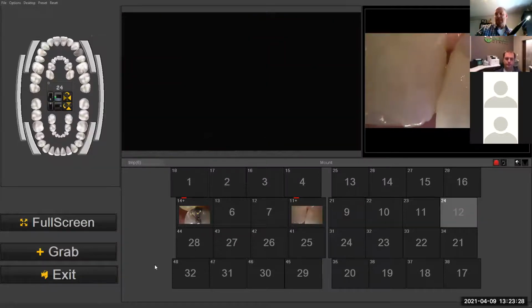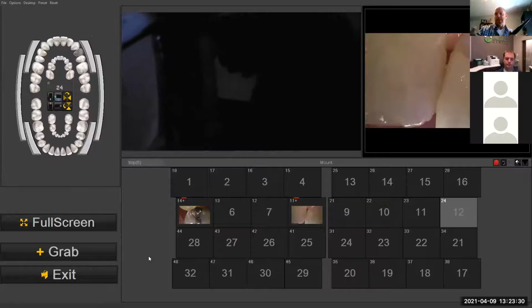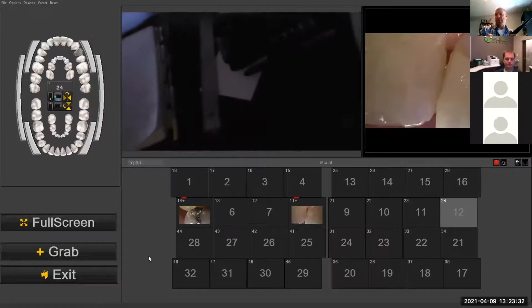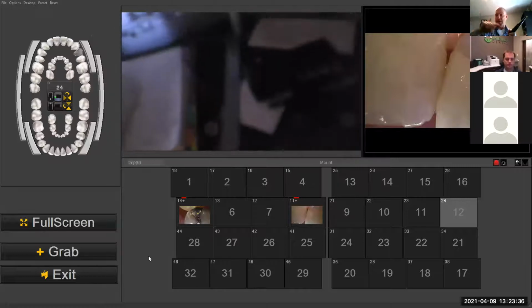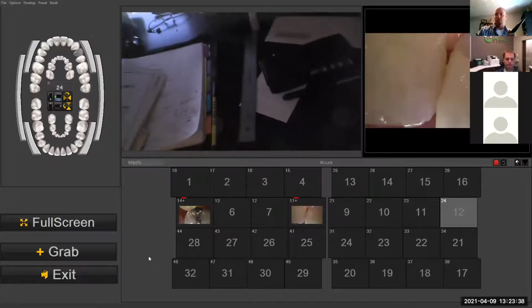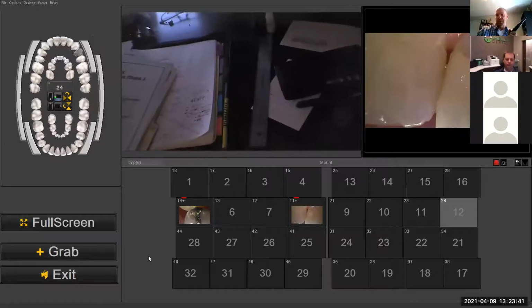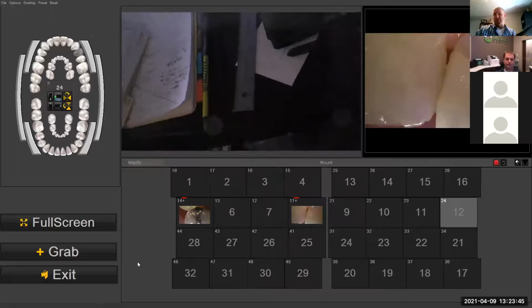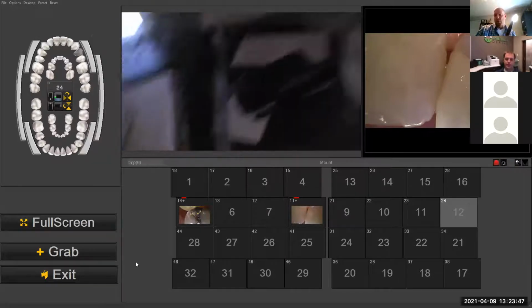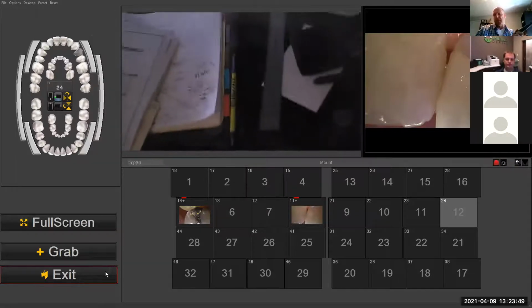So what this does is it allows the staff to quickly and easily acquire the images underneath the tooth number, and there's no post-acquisition administration, typing, dragging onto the tooth pictures, and trying to figure out what tooth that was after they've taken 30 pictures. They don't remember what tooth it is, and then they have to go back in the mouth. And so there's a whole bunch of time wasted there. So with this system, it saves a valuable amount of time.